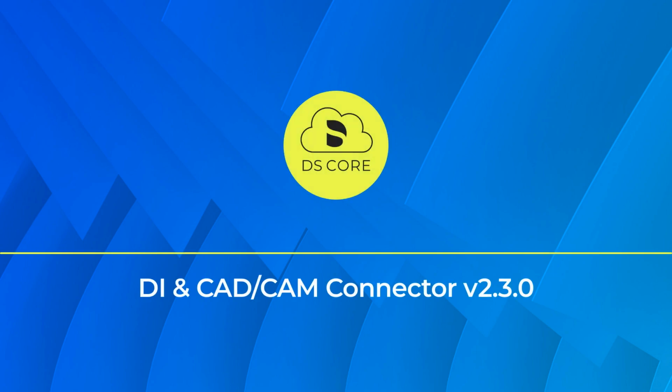In this tutorial, you learn how the latest DI and CAD/CAM connector strengthens your digital workflow by improving connection stability and supporting the latest CEREC and in-lab CAM software versions.